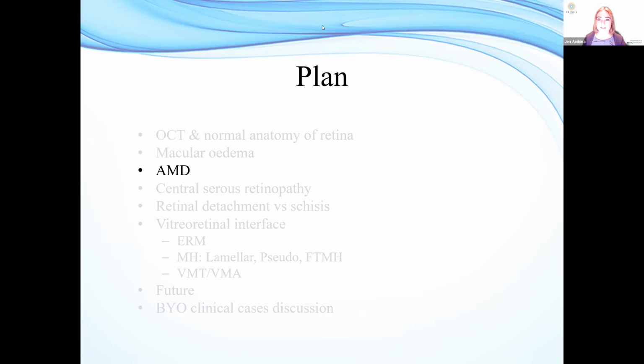Before we move on to the next section, I just want to check the Q&A in case there's, yep, it will be available for playback. How do we know if it's an intraretinal cyst or exactly? Well, that's what I was saying just now. There's no way to know if it's an intraretinal cyst or just a space, because you work it out from the context. Like my post-operative patient, if they hadn't had VR surgery and you just saw the second picture, you might think it was a macular edema post-cataract or related to something else. It's all in the context, and it's all comparison, one scan to the next.